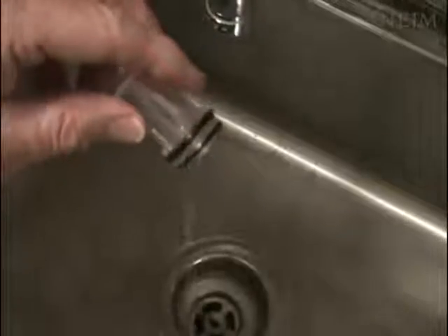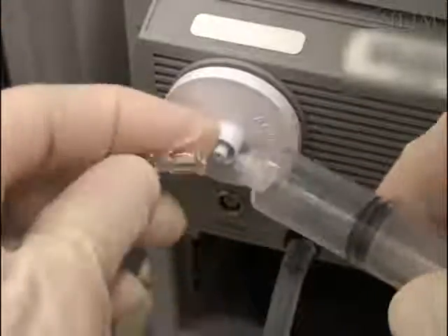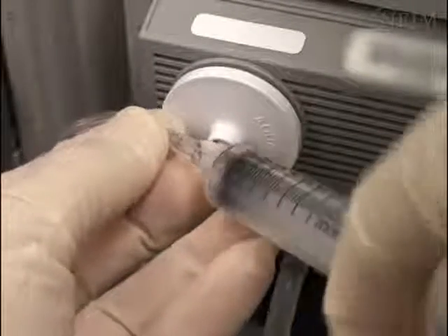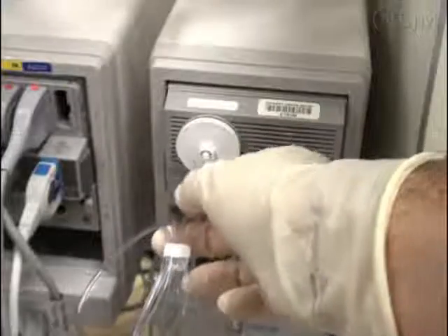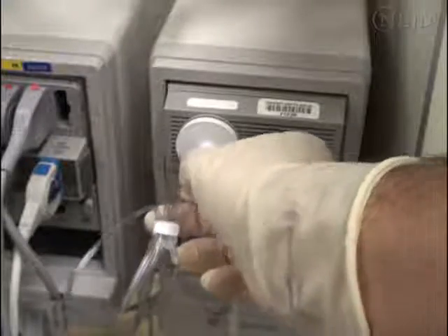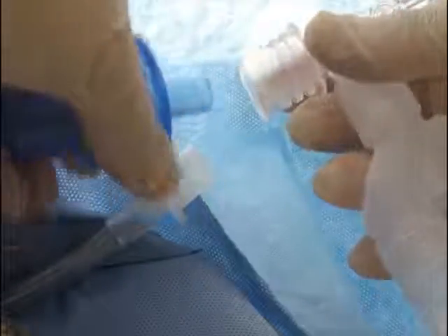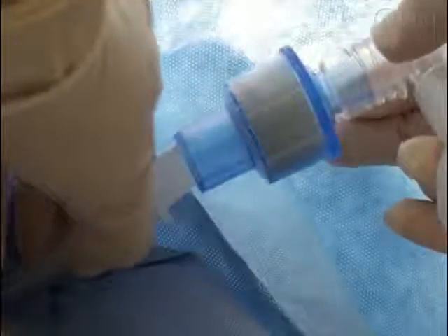The sampling line or water trap may become occluded with condensed water. Disconnecting the sampling line and flushing it with air from a syringe can sometimes clear it, but it may be necessary to replace these components. Elevating the sidestream sampling line above the ventilator circuit helps prevent the entry of condensed water. A humidity barrier is also useful, although this will increase the response time of the capnogram.